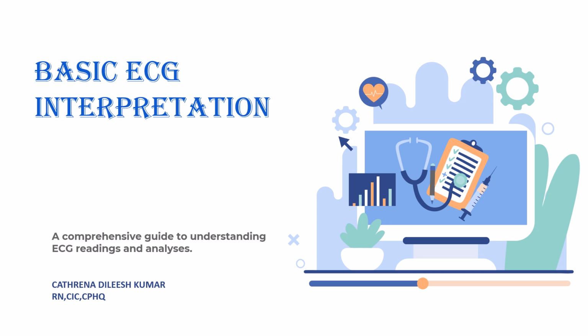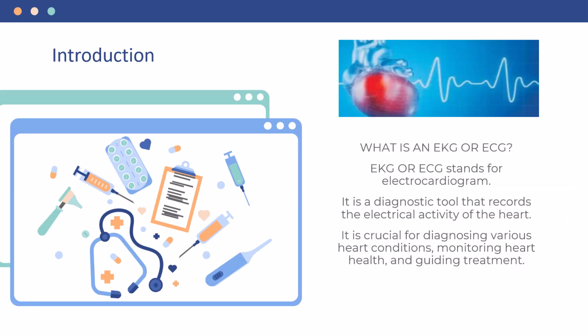So what do you see on an ECG strip? How is it similar to what is happening inside our heart? Most of the time we miss the basic components of an ECG strip. An ECG strip is nothing but the footprint or the blueprint of what is happening with the electrical activity of your heart. So today we will just go through the ECG reading and its basic analysis. And as you understand the concept, in the future episodes, we will discuss each case separately.